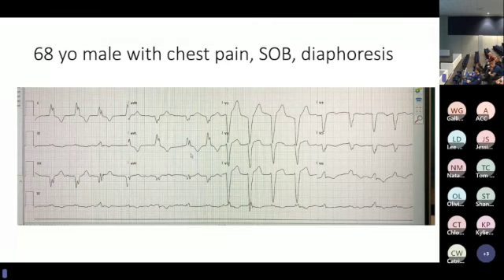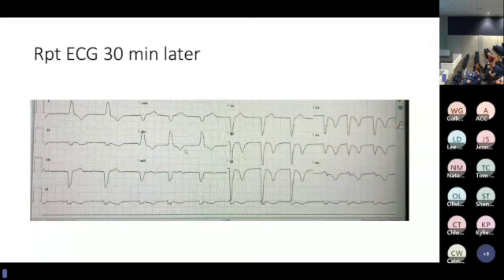But then this is that patient's ECG 30 minutes later. Any thoughts about that one?